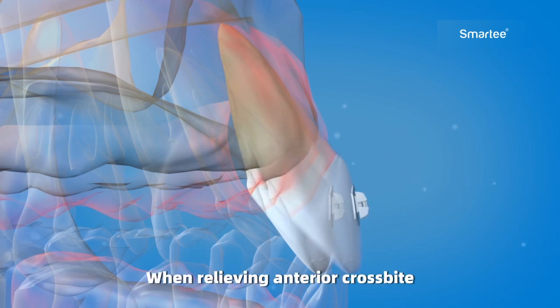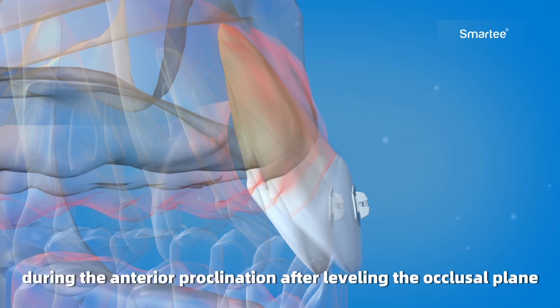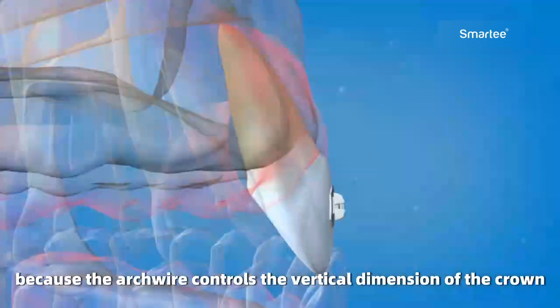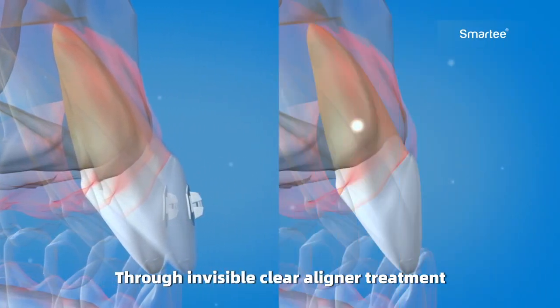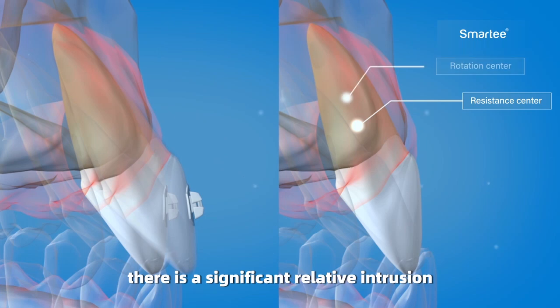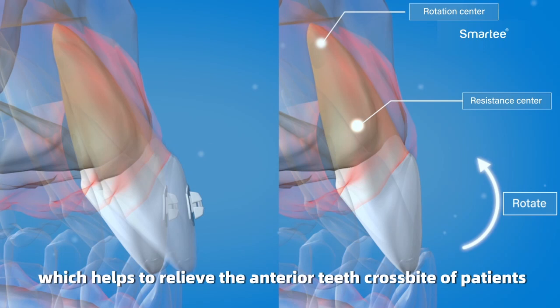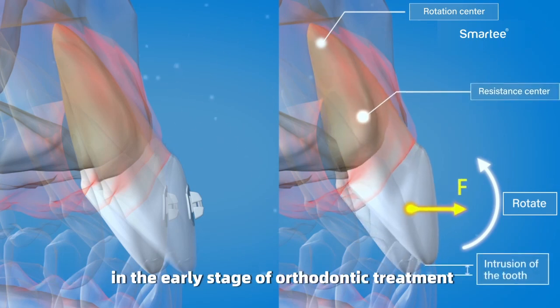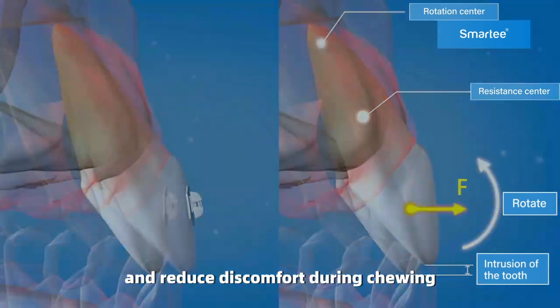When relieving anterior crossbite using traditional fixed orthodontics, during the anterior proclination after leveling the occlusal plane, anterior extrusion is inevitable because the arch wire controls the vertical dimension of the crown. Through invisible clear aligner treatment, there's a significant relative intrusion on the anterior teeth during proclination, which helps to relieve the anterior teeth crossbite of patients in the early stage of orthodontic treatment, to avoid occlusal trauma and reduce discomfort during chewing.